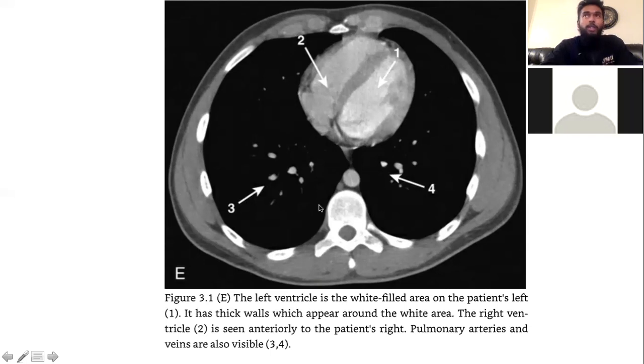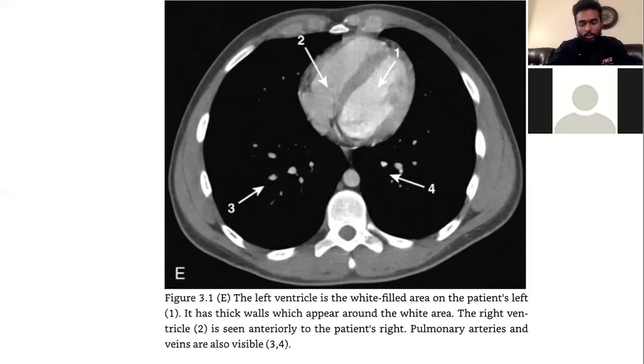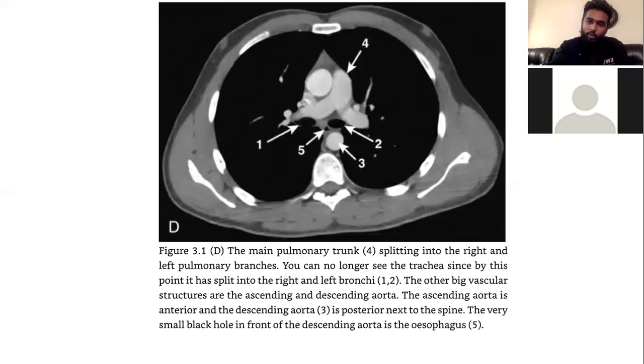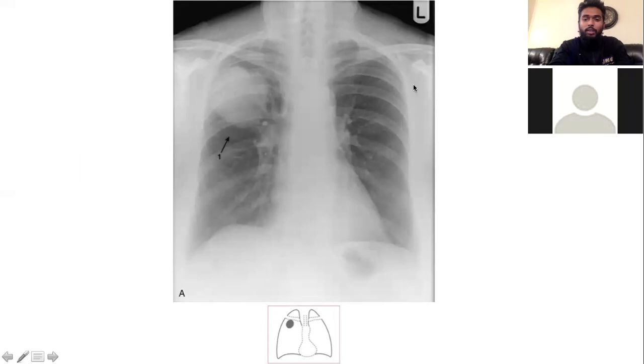So question, Kenny, on a chest X-ray, those little white things you see in a black lung, what are those? You see these markings, what are all these things? Some vasculature. Yeah, pulmonary arteries and veins, right?